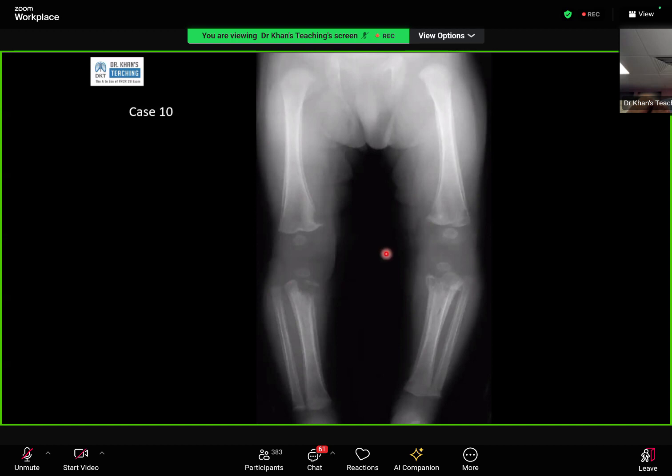Also, whatever the differential which is relevant in this age group, mention that other than these erosions, rest of the bones appear normal in density. Then there is no evidence of Wimberger sign as far as the epiphyses are concerned. There is no Pelken spur. There is no metaphyseal cupping. So indirectly, you're telling the examiner that I did consider these things in my differential, but I have ruled that out. In the end, you will say that the findings are pathognomonic for congenital syphilis.